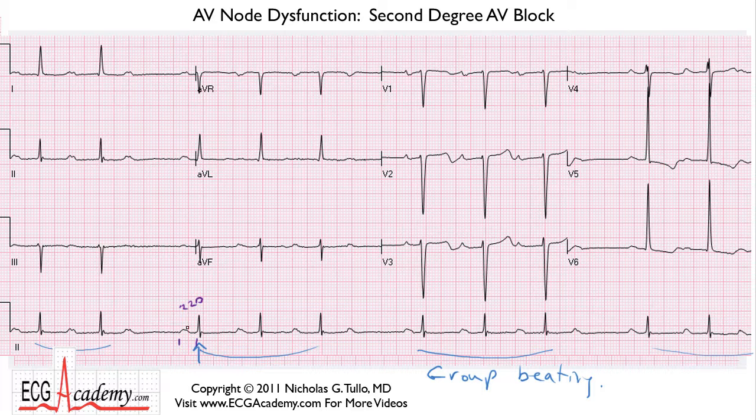In other words, do we have just a sinus rhythm? Well, let's take the next P wave, and if you want to make it easier, you can take your calipers, bring them on down, and put them on top of the beginning of the P wave, resize them, and then if you march these calipers out, you can see that the P to P interval is really quite regular. Okay, so the P's are marching on through.